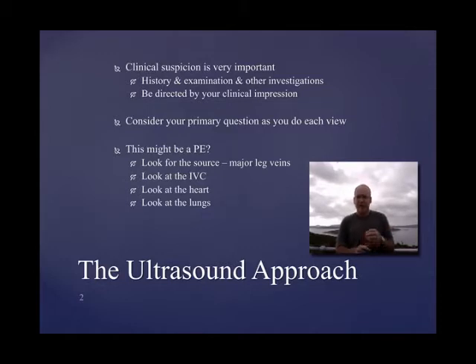So if you thought, and you're sure, they were having a pulmonary embolism and it looks like there's a pericardial effusion, does it make clinical sense? Could it be a pericardial fat pad? And if you're not sure, it's important to get it checked.